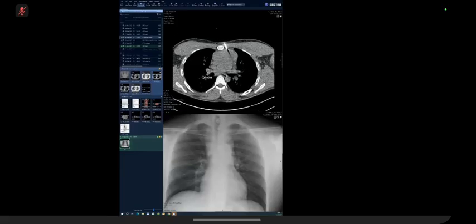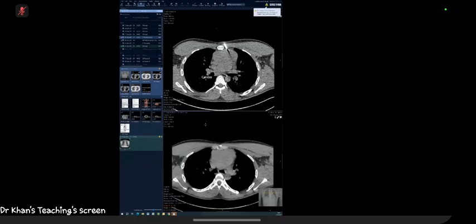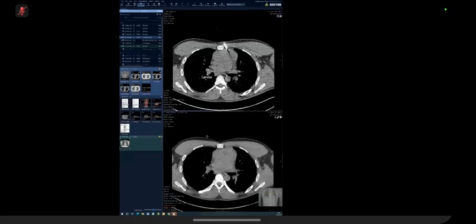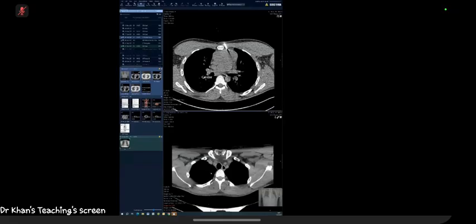This I think actually turned out to be thymic, but you have to say all of them, and you have to say calcification, no calcification, cavitation, no cavitation, because that's what changes the differential for them, especially when they offer you the CT, because they're not showing you the CT to confirm your diagnosis. They want you to say, I don't see any calcification in it. I see some low attenuation within it, suggestive of a degree of necrosis. I am following it upwards. It does not seem to communicate with the thyroid, things like that narrow down your differential a bit more.